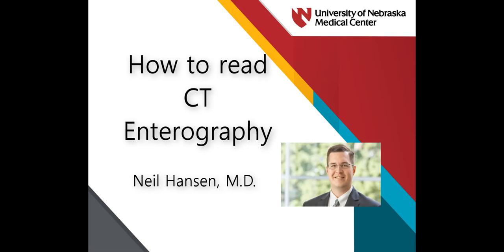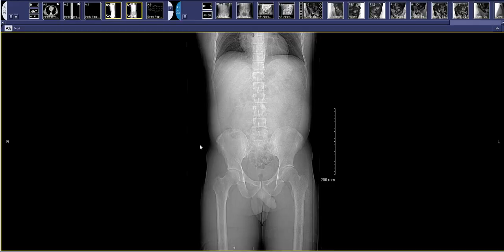I'm taking you through a CT enterography. The protocol for a CT enterography is a little bit different than your regular abdomen and pelvis CT. The indications for CT enterography usually are related to inflammatory bowel disease. The main difference between a CT enterography and a regular CT is the type of contrast given.